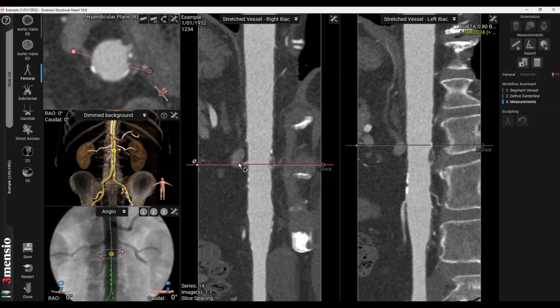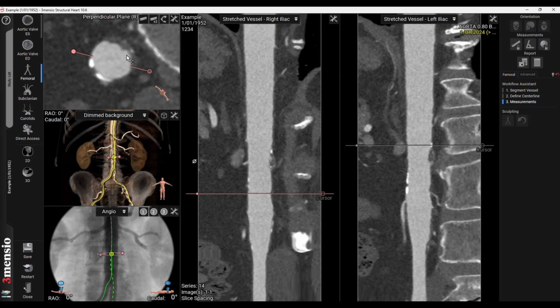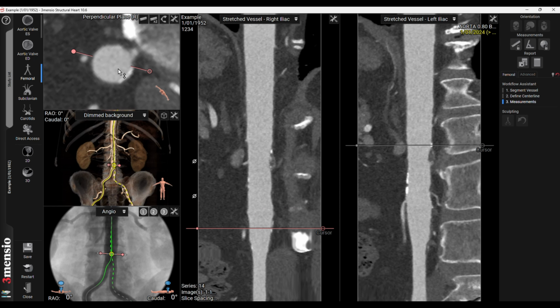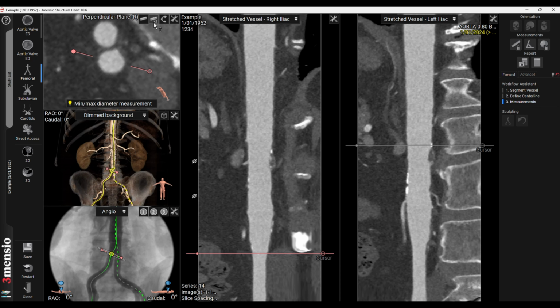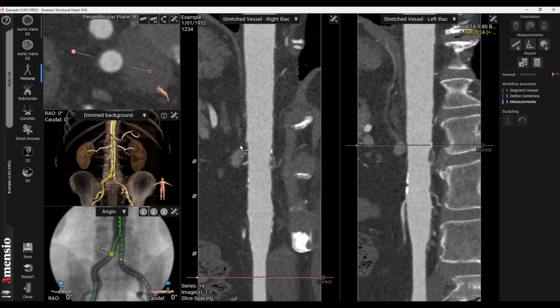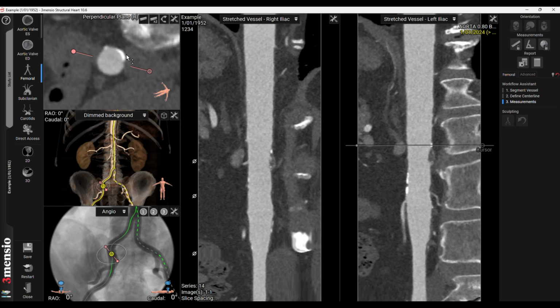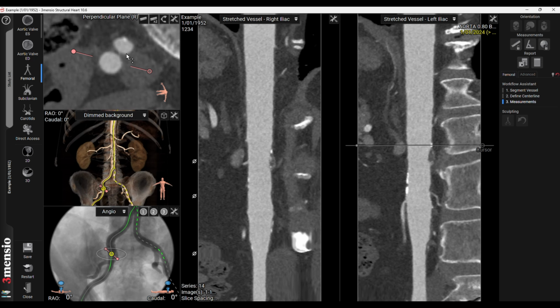So this is similar to the aortic section where we're just going to take measurements from the renals down, and we're just going to use the two ruler tool, as you can see here, and we're always going to go inside. So this patient has thrombus and some calcium, and we always want to find our most limiting factor. This then helps us know what we're going to interact with in the patient and the prosthesis that we're going to select, and if that's going to have any implications, if we're going to dislodge anything, or if we're going to open up a dissection.